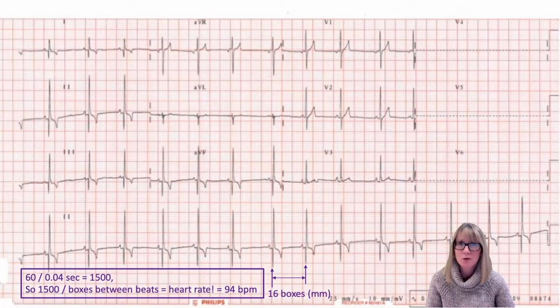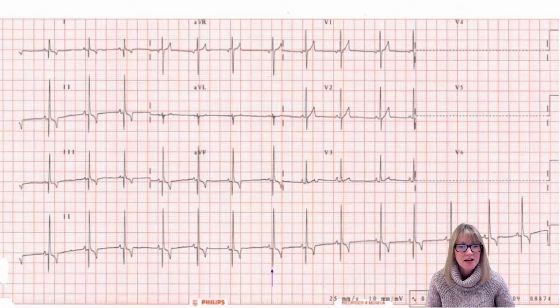And this is the basis for one of the common rules that many of you may already know about, which is the so-called 300 rule. And so just to review that, if we're to pick a heartbeat, and specifically what we want to do here is pick a heartbeat that lines up with the darker red or broader grid lines. And so I've selected one of those with my arrowhead.